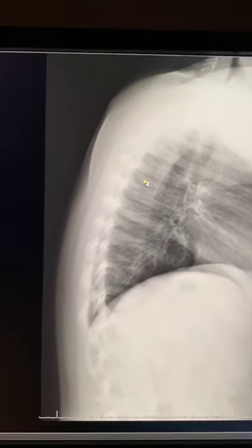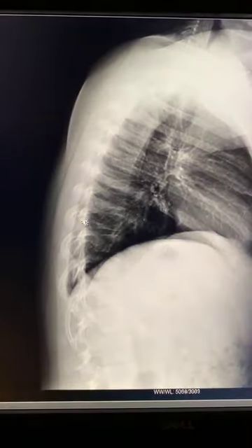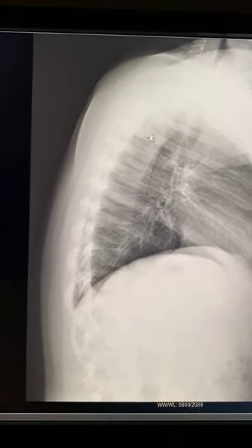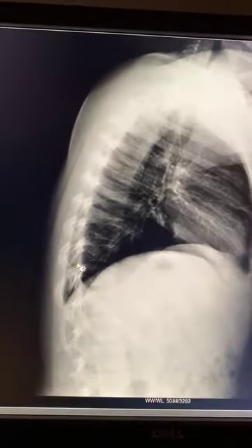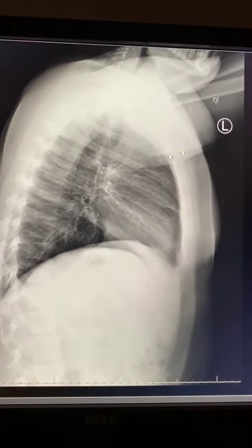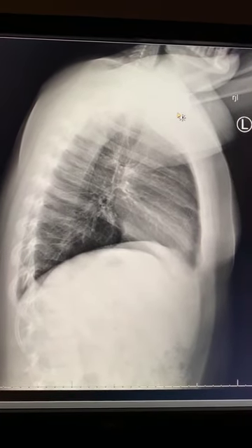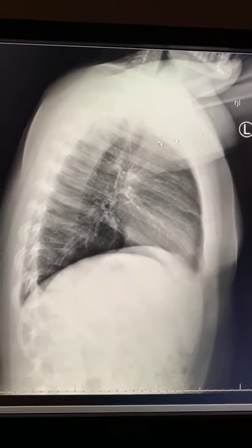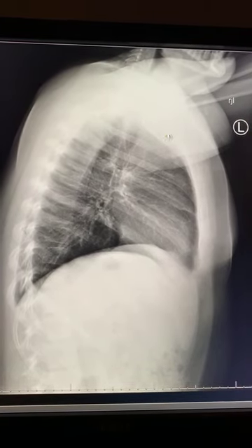All right, don't forget, by the way, you still are responsible for this spine. So you better be looking at all this stuff right here. You will catch fractures, you will catch osteomyelitis, you will catch stuff, so you are 100% responsible for that. Some people may ask, what's all this tissue right here? Well, when the techs take x-rays for these patients, they have their arms up like this. So that's what the soft tissue is right here.